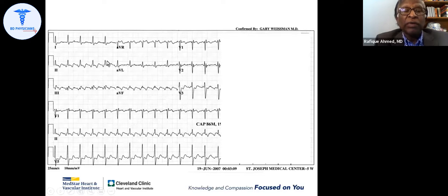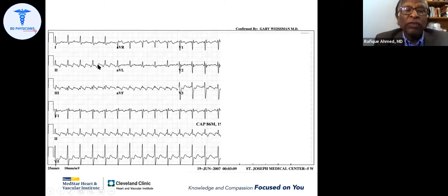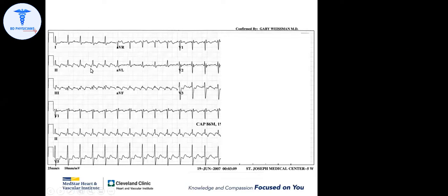Okay. In your mind, ignore the QRS complex. Just erase the QRS complex in your mind. What does it look like? Does it look like a saw? Yes, it looks like a saw. Exactly. So this could have been a T wave, but if I imagine this without the QRS complex, it looks like a saw. If it is a sawtooth appearance, what is it? It's the atrial flutter, sir.